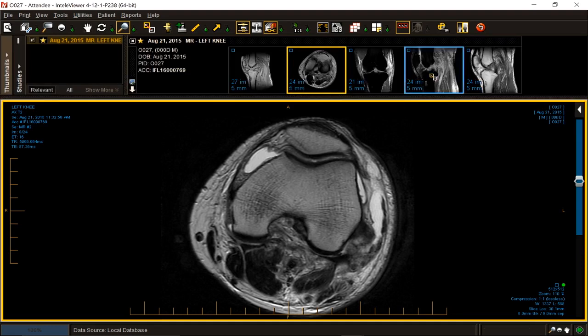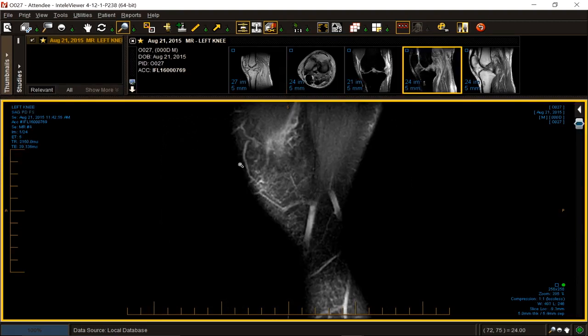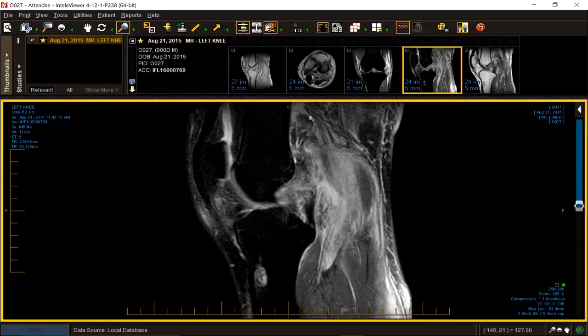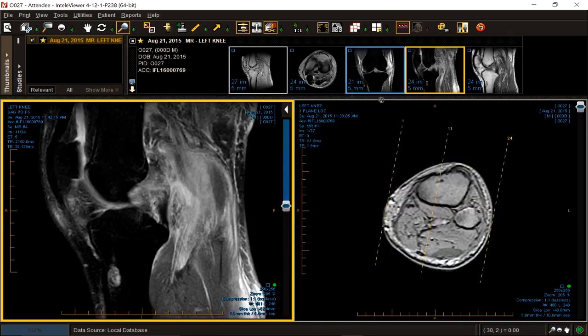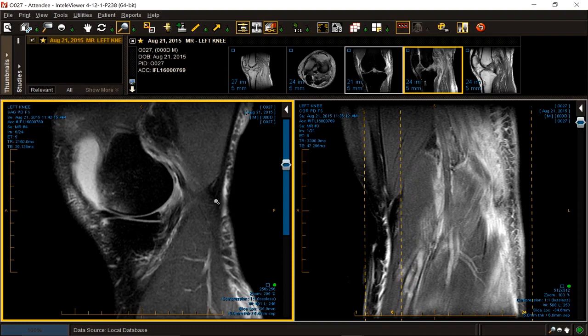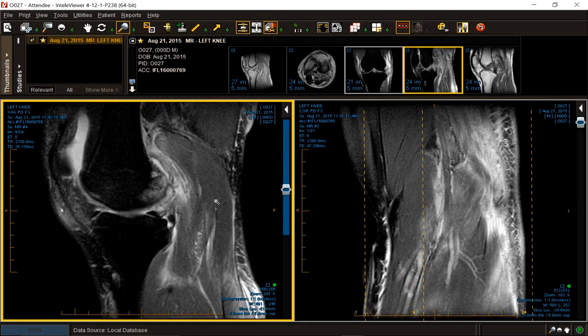But not all of you are masters, but you will be, because you have passion and you're here. So let's pull out the water detection sequence, the sort of search and destroy sequence, and we have two of them. We have a coronal and a sagittal, thank goodness. But on the flip side, there's swelling, there's edema, there's morphologic disruption everywhere. So what's a mother to do?